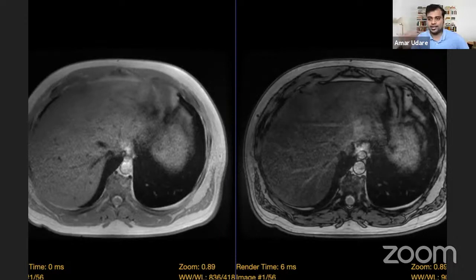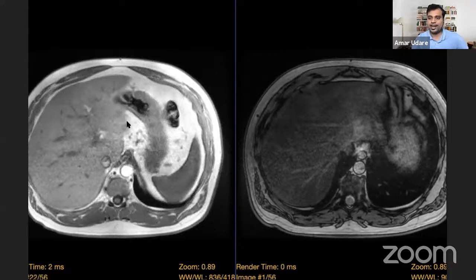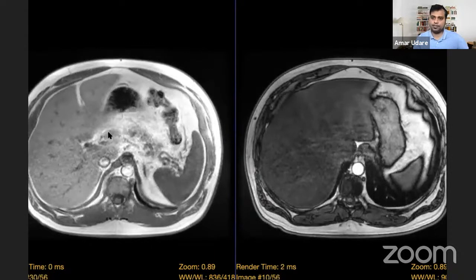Then is where you need to do other things to confirm the pathology, especially if there is a known metastasis. If the patient does not have a known primary pathology, you can be rest assured that this is probably an incidental adrenal adenoma. In this case, the patient had lung cancer, so we had to do an MR. So on MR, how do you distinguish an adenoma versus a pathological lesion? Because adenomas have intracytoplasmic fat, we can diagnose that fat on in and out phase images.